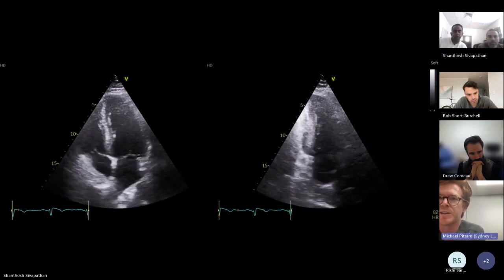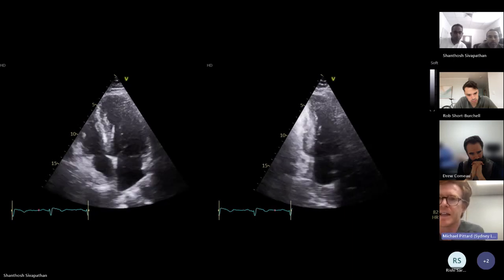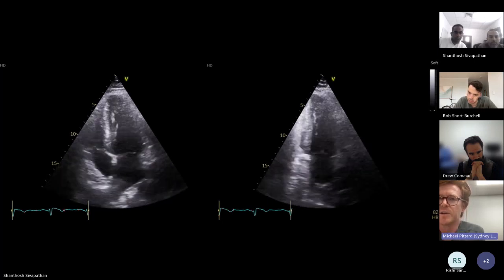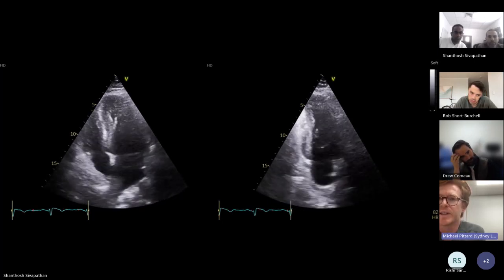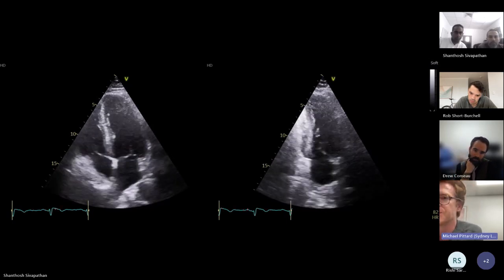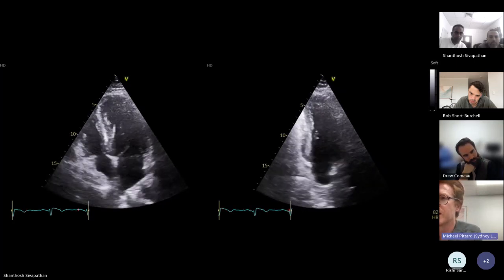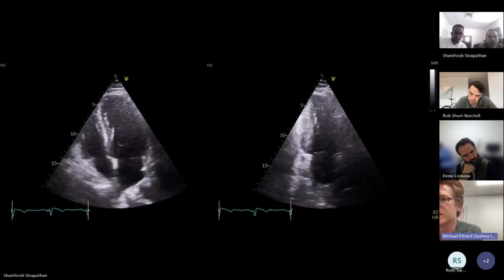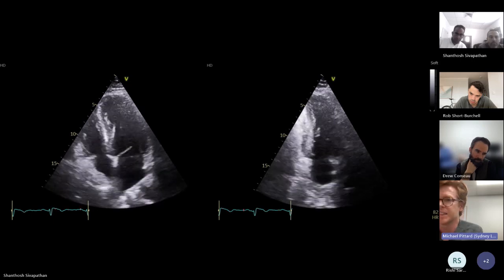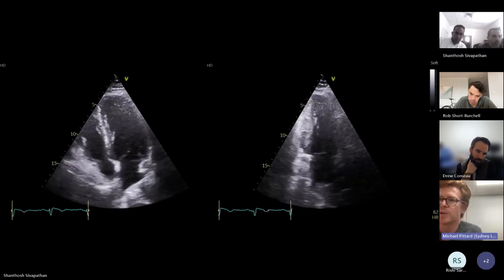Yeah. So some apical images, 4 and 2 chamber. Maybe the left atrium does look a little bit big. Now the inferoseptal wall looks hypokinetic or akinetic, and the rest of the heart looks like it's compensating. The right looks like a normal size with normal contractility. And in the 2 chamber, again, I think the inferior wall is hypokinetic and maybe looks a little bit bright, like a high sort of brightness. I can't quite see the apical wall on that image, but if it's in keeping with the rest of what I'm seeing, I'd say it's probably got normal contractility.